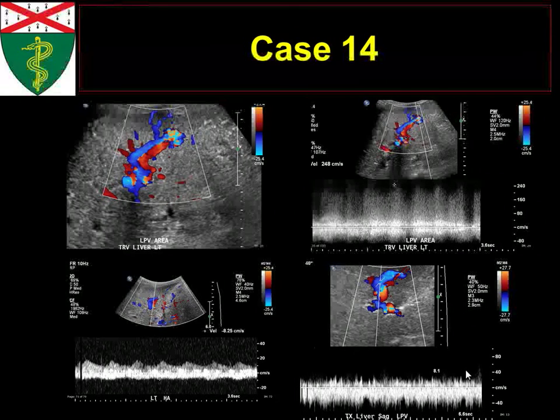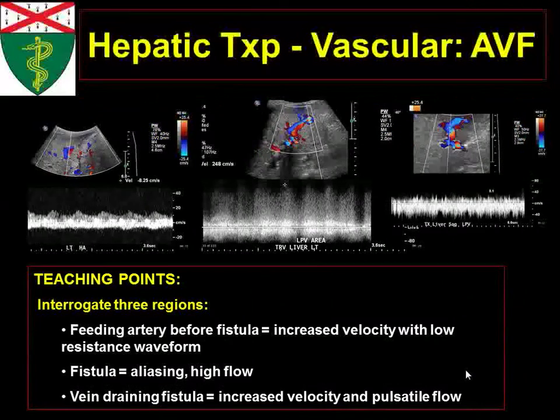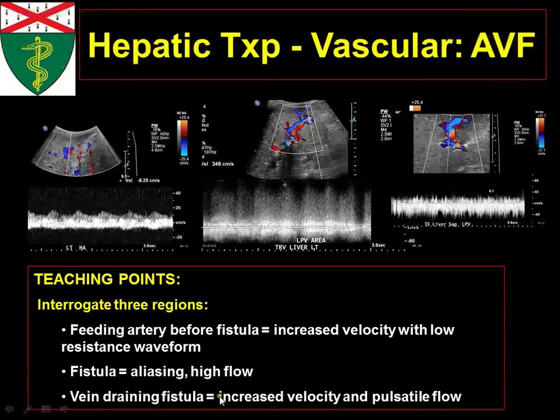Perfect. Hepatic artery to portal vein, arteriovenous fistula. And these can be kind of the toughest cases to detect because they can be very small and sometimes inconsequential. It can also be tough because you have to look at a constellation of findings to put it together, and you did it perfectly. So this is hepatic artery to portal venous fistula. In these transplant patients, this happens after biopsy. This patient's liver wasn't doing too well. They biopsied that area, and they probably created an iatrogenic fistula.